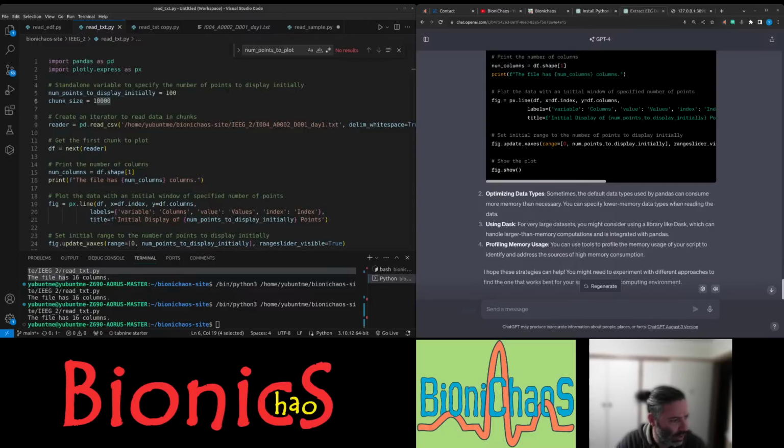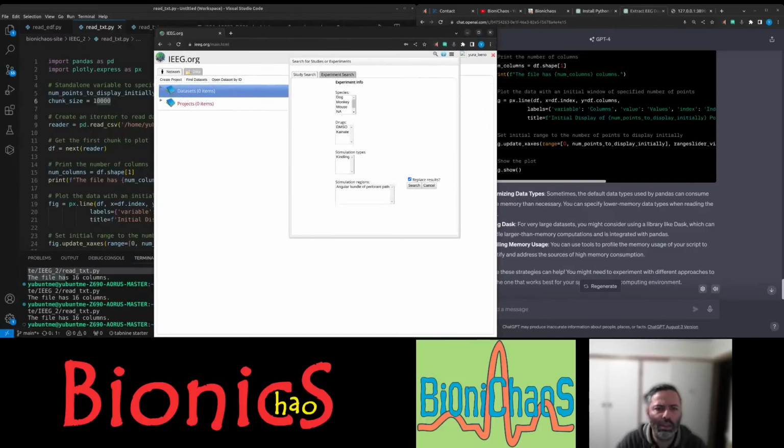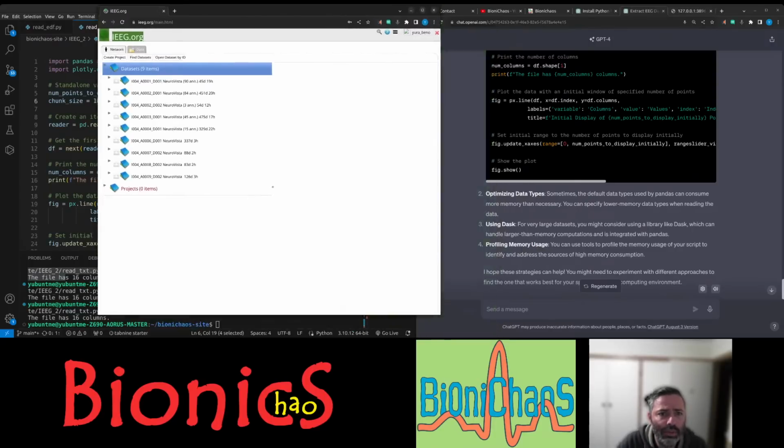Let's see. Yeah, just log in again. Find datasets. List the 9 items.